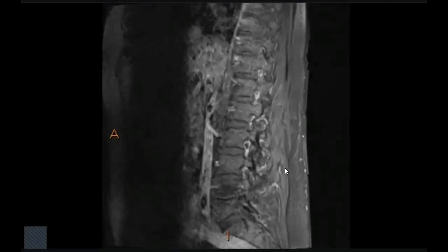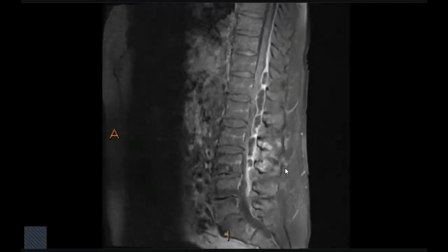My differential diagnosis in this case would be tuberculosis as well, and these can be loculations of TB. However, TB would be less likely since it would more likely involve subligamentous spread and spare the discs and involve the end plates. So this is less likely, especially given the history of lumbar puncture.